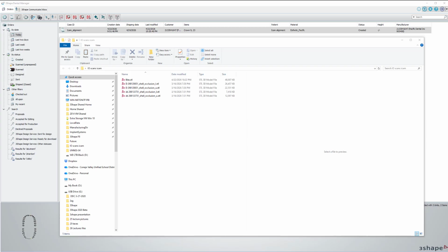Because, you know, I've been on 3shape since 2012. I'm a KOL since 2019. So why not? Why not try to keep everything in the 3shape ecosystem? Not saying it's better, but why not? Let's try. So there's not a lot, it's pretty easy as far as what you need to do.